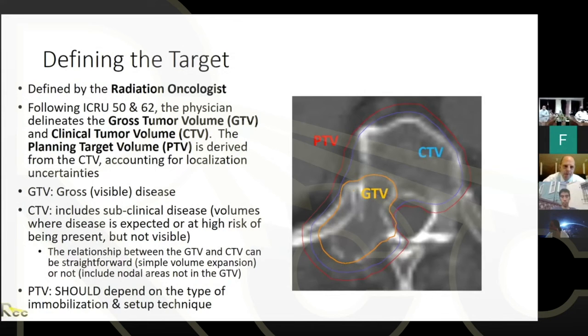larger. The one thing I will note about this is that sometimes we may not entirely follow this GTV to CTV to PTV definition. In some palliative cases, there's other ways to do this and still do 3D planning. The physician, for instance, may define just the field shapes or something like that. But typically, this is what is recommended: define the GTV, the CTV, and the PTV.